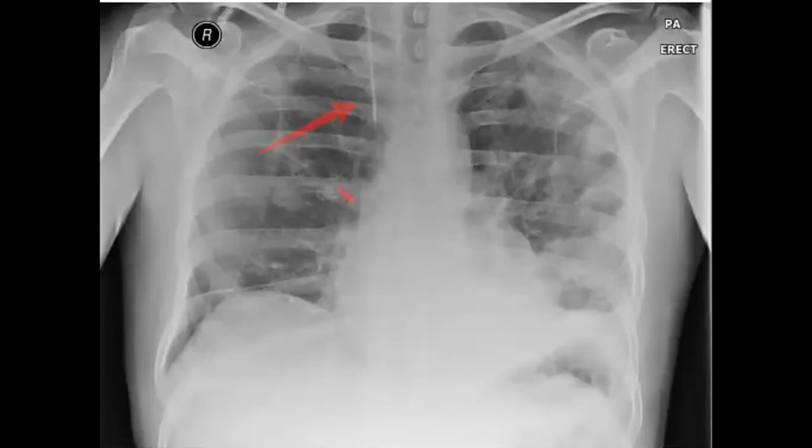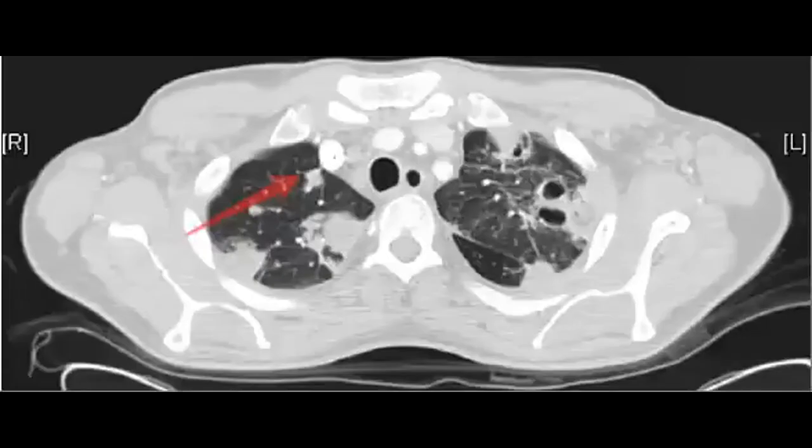So you would like to shift to CT, to see if CT can help you. Maybe let's go and see. So there are some selected images of CT, and I wish that we can reach together how we can think.